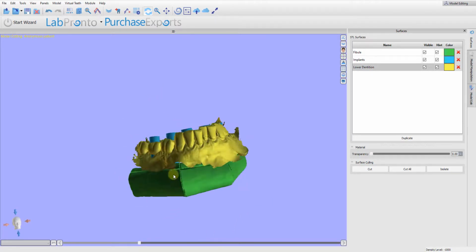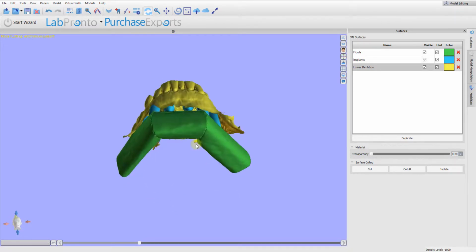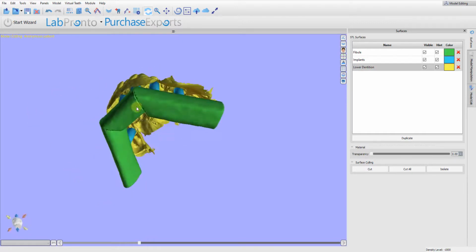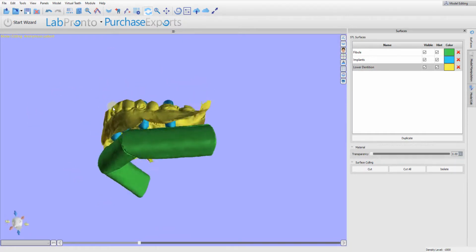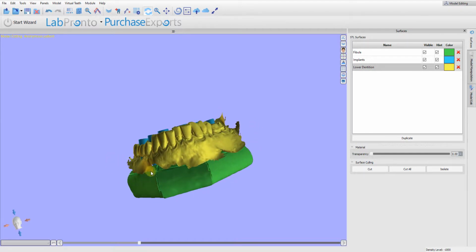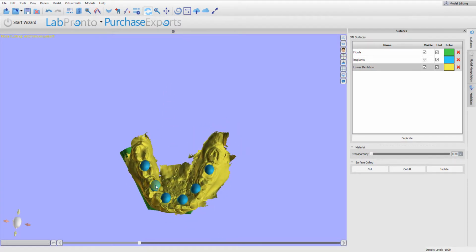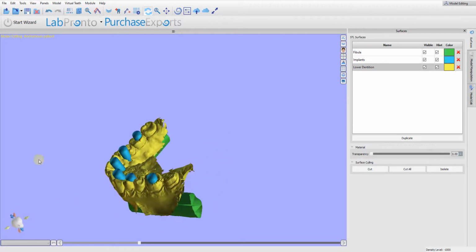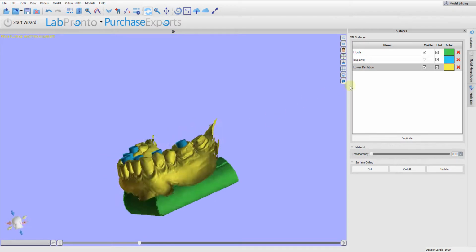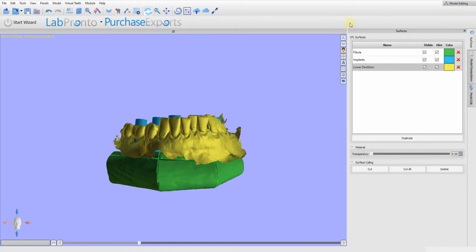So the goal of this is we want to take this intraoral scan in yellow, and it's a shell right now. We want to do a digital pour to make it a solid model. Then we're going to cut off the bottom part of it to have a little space above the fibula. And then using different software, we're going to make the holes where these virtual abutments are. To start the process here, we're going to do a digital pour of this yellow model.